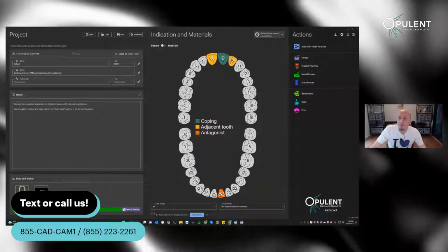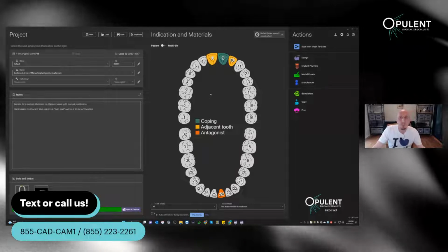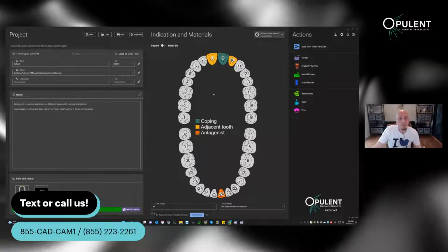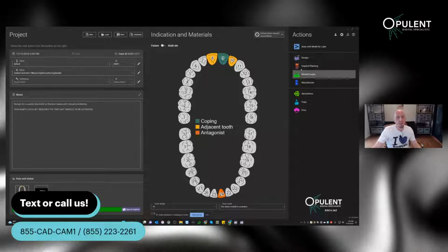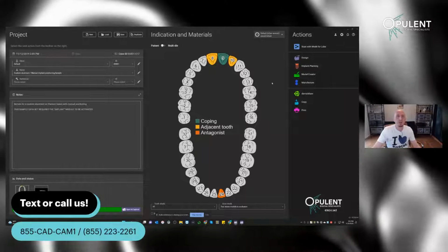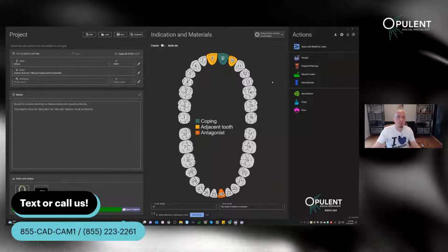All right. So today, plain and simple, this is one of the demo cases. When we're installing Exocad, we are already incorporating everything in here. So you see that there's already the implant planning available here, and the partial would eventually be available, etc.